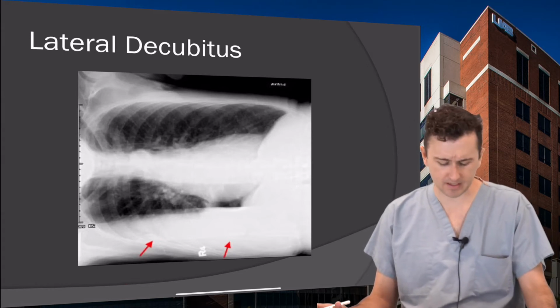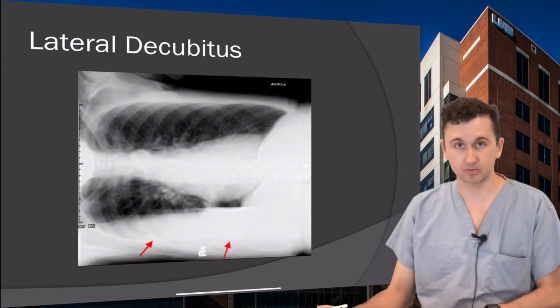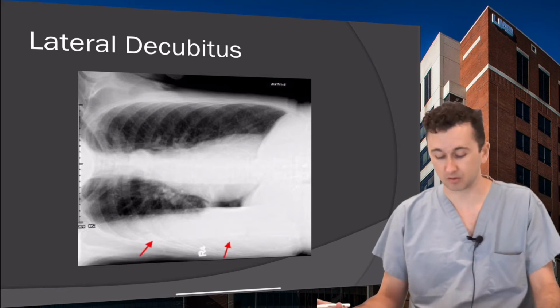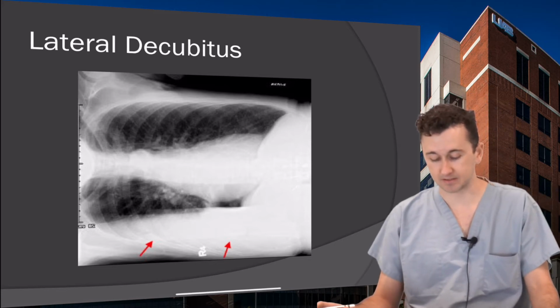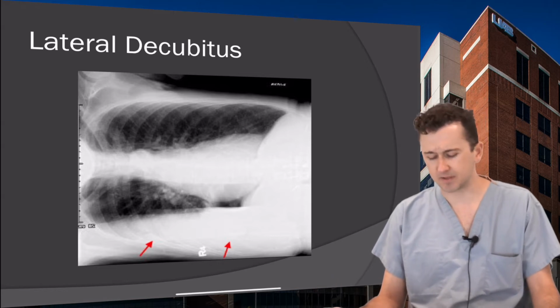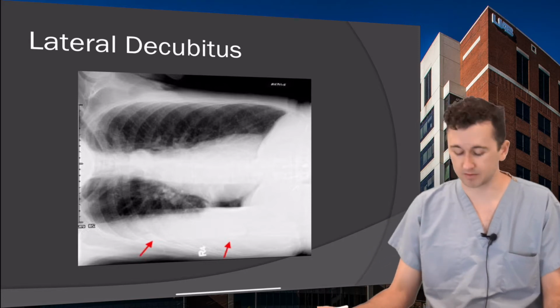The other thing is that most patients that have an effusion the size of the one you see here are going to be really short of breath. They're not going to be able to tolerate lying like this, and odds are they're going to need to be on oxygen as well. So there are a lot of limitations, and they're not done that often, but they can be helpful in certain situations.